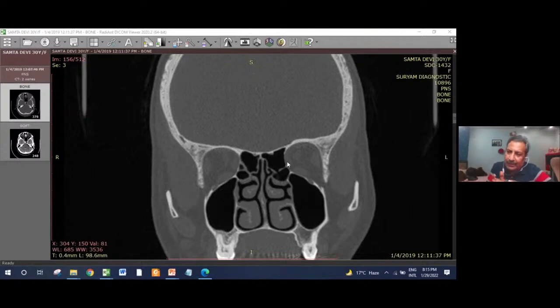The frontal sinus is like a box between bony walls, and if we assume a three-dimensional image in our head of what exactly the box boundaries are, the understanding becomes much easier. So here again it is like a box. This is the superior turbinate making the medial wall. This is the orbit making the lateral wall of the posterior ethmoid. The thick posterior ethmoidal roof is very, very important, and this turbinate is attached to the posterior ethmoidal roof.